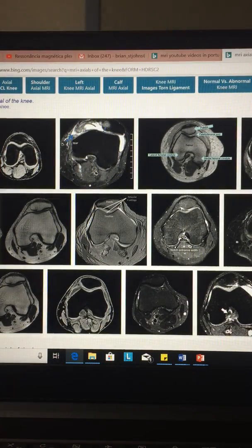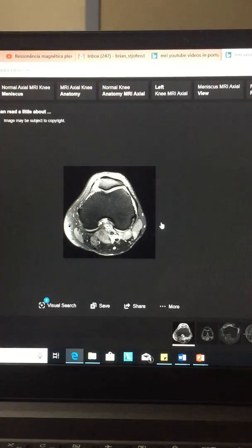Right off the bat, I can see this is going to be the more flattened surface and this is the more rounded surface. This has to then be your lateral aspect. Here, this is the straight and flattened surface, this is the more rounded. Because you're always going to angle your sagittal images with the lateral condyle. Okay?